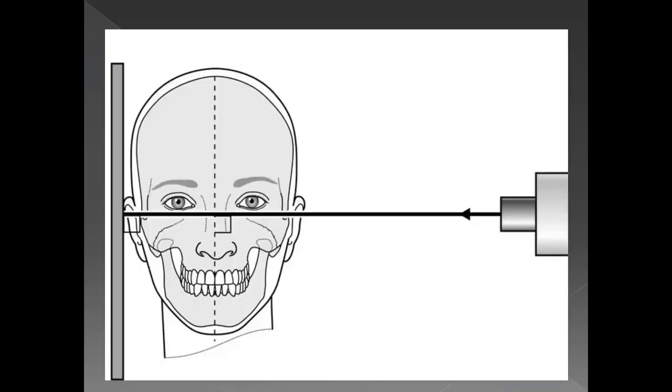So how is it taken? Well, it's taken relatively straightforward. The position is quite standard. The nasal bone is also covered. I'll come to that in the anatomy that you see. Just like you see the nose on a lateral ceph, you will see the nose on a lateral skull as well. Both X-rays are quite similar in that regard.